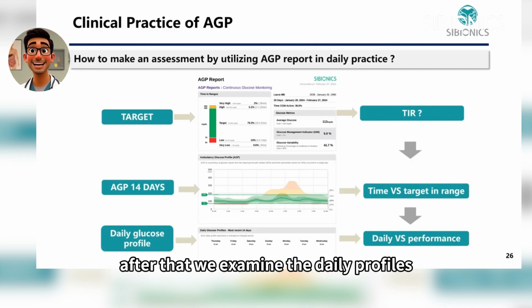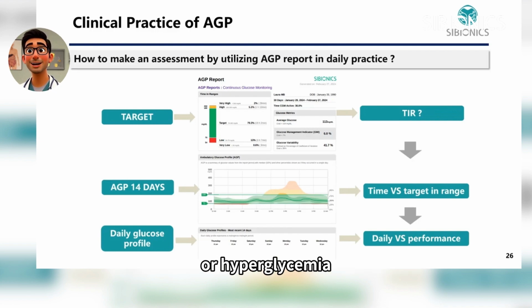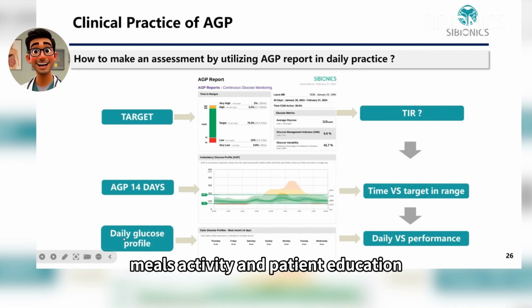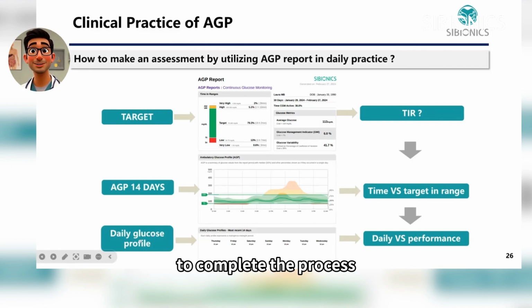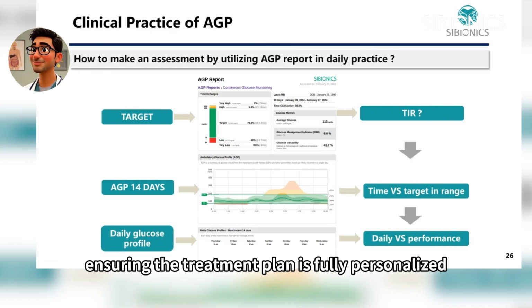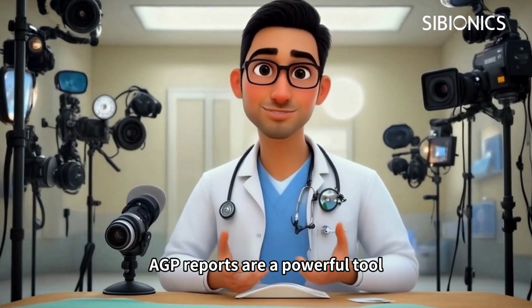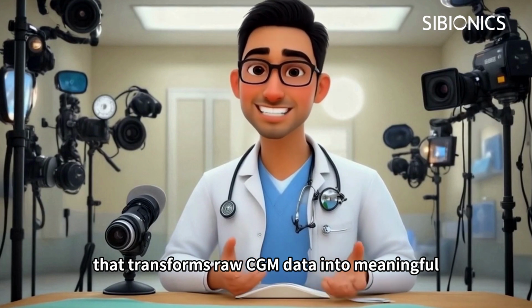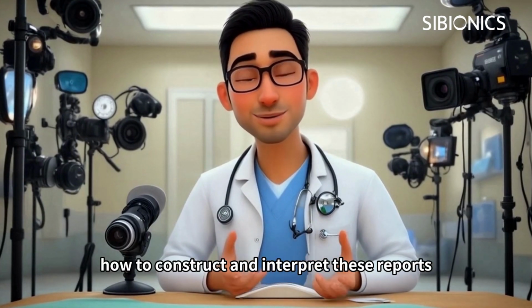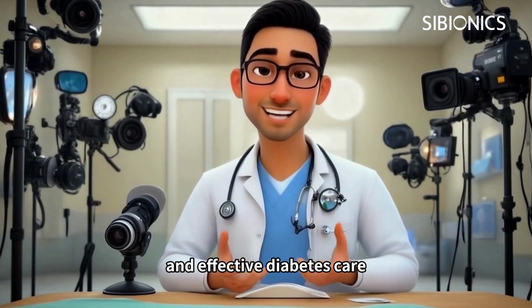After that, we examine the daily profiles to detect specific episodes of hypoglycemia or hyperglycemia. These insights help guide decisions around medication, meals, activity, and patient education. To complete the process, we compare the data with the patient's routine and symptoms, ensuring the treatment plan is fully personalized. In summary, AGP reports are a powerful tool that transforms raw CGM data into meaningful clinical insights. Understanding how to construct and interpret these reports allows healthcare providers to offer more personalized and effective diabetes care.